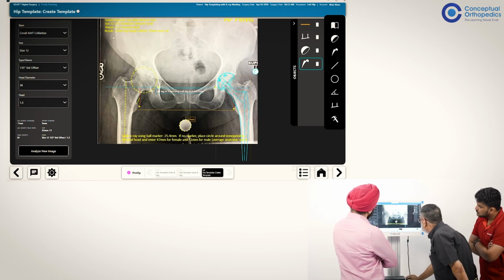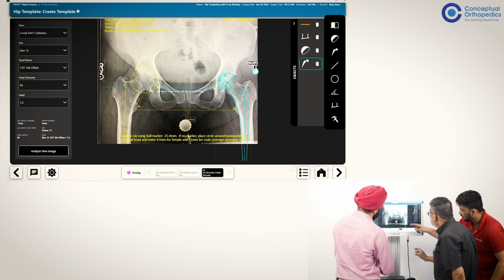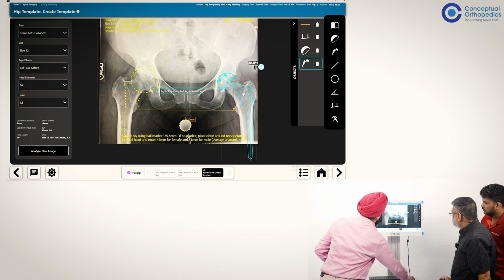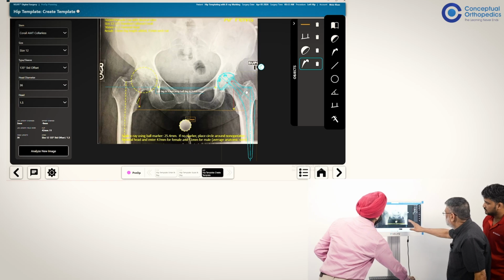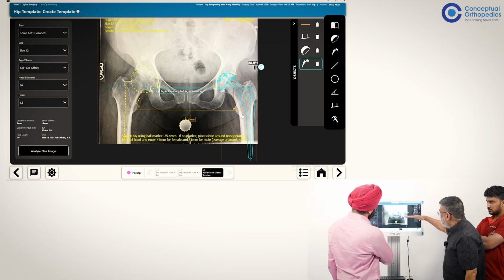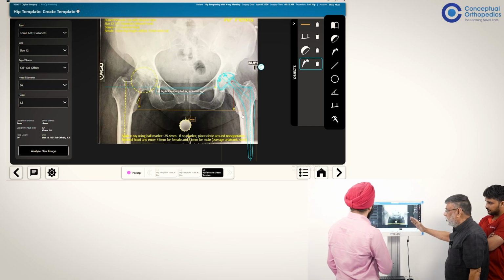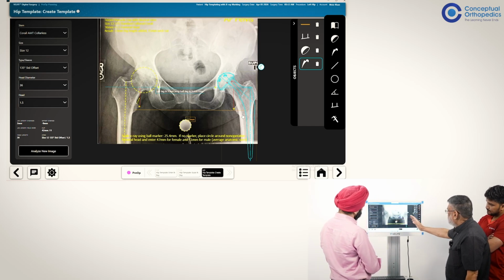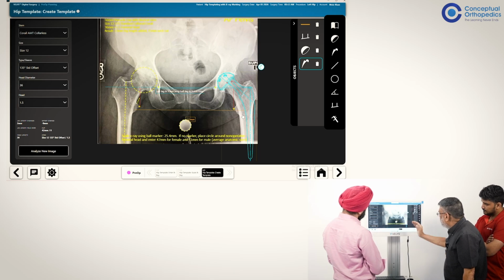If you say, can I move it? Yeah. So let's say it's coming there. At the moment, what will happen after reduction? It will go in this axis, think of the x-axis and y-axis. When it goes in, the offset will decrease. And when it comes a little down, it may increase.